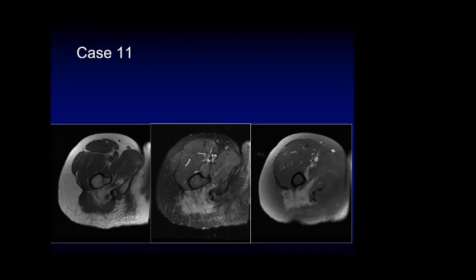It's the thigh, the femur and the ischial bone. Ischial tuberosity, yes, ischial bone and femur. So it's the region between them, the ischiofemoral region.